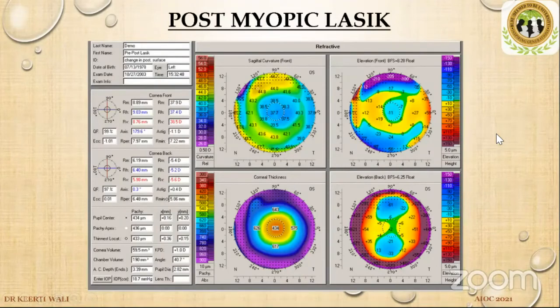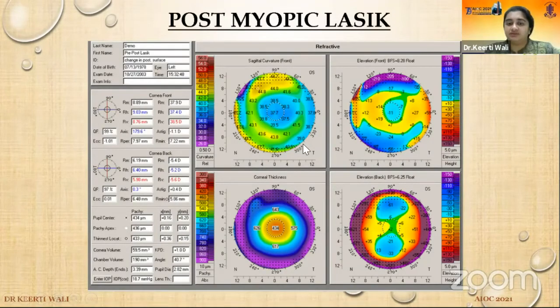Okay, sir. So this map is showing us, on the corneal thickness map, the thickness is 434 and it's in red color. Hot colors, so suddenly we feel like, okay, maybe it's an ectatic cornea. But then when we see the elevation map, there are some points, +14, +19, which are in the pathological range. But in the posterior, this is not coinciding. Like here it's +4, +5. It's very less. So this is not coinciding with a suspicion of ectasia.